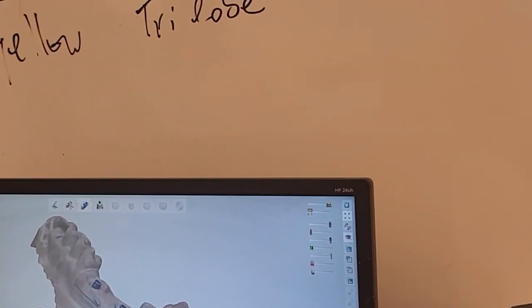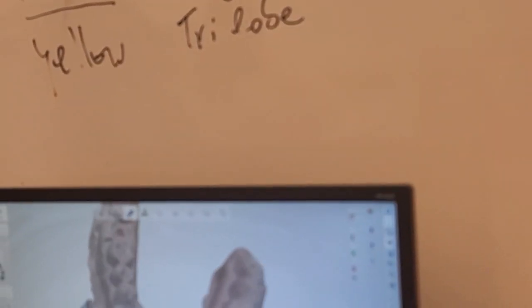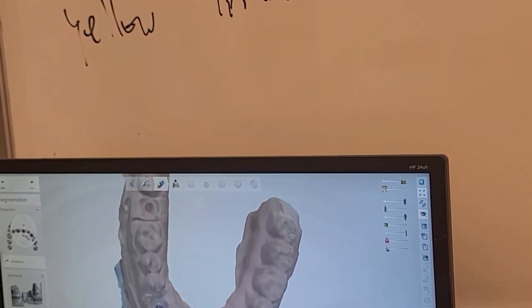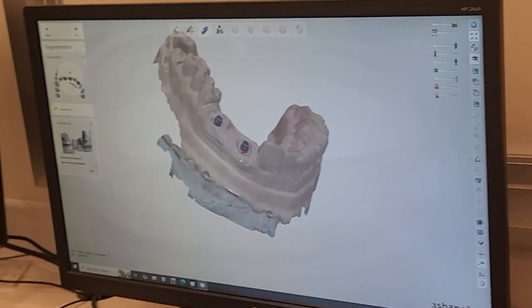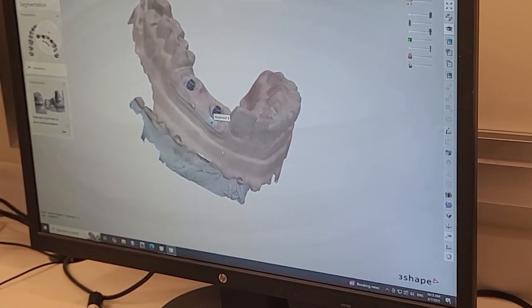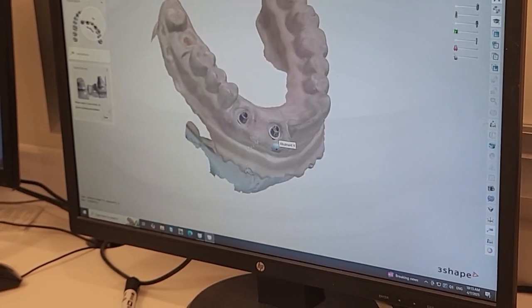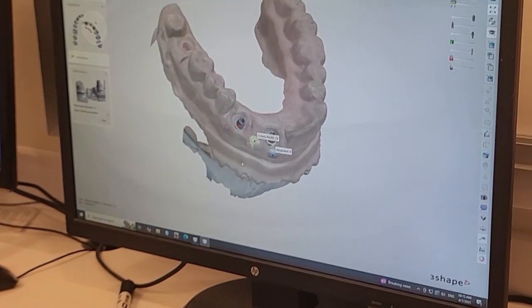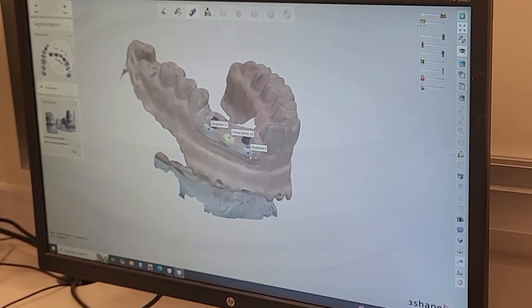Please select the abutment 9. So you see that little flashing dot, right? You can move it anywhere you need it, okay? For our implant purposes, I always put it on the gum, not on the implant, okay? So, abutment number 9, we good. Now it says, please select crown pontic, okay? So, again, on the gum, okay? Please select abutment number 11. Again, I'm gonna put it on the gum, okay? So I selected correctly, make sure.